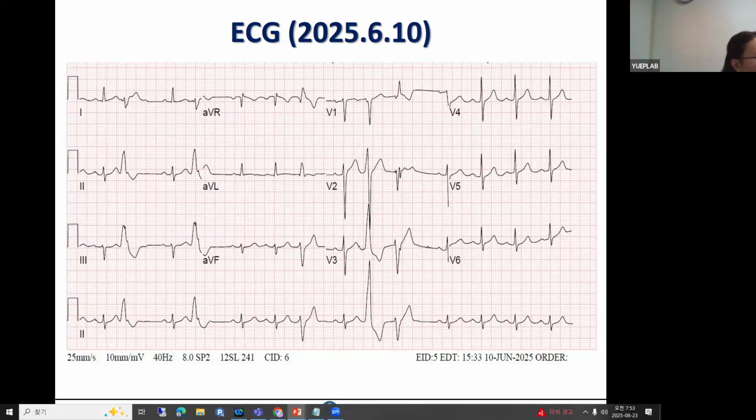I think there's interesting physiology, but the question is why this patient has so many different PVC morphologies. Obviously, the more variation in PVC morphology, the poorer the prognosis compared to single monomorphic PVCs. Also, the narrow QRS rhythm conducted from the P wave shows a left anterior hemiblock, so this patient definitely has some conduction problem.